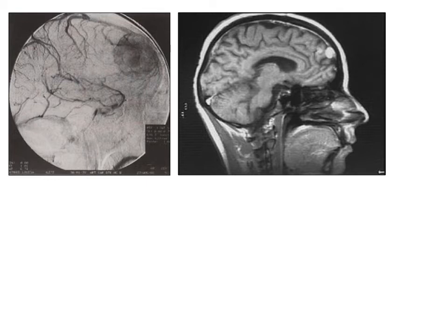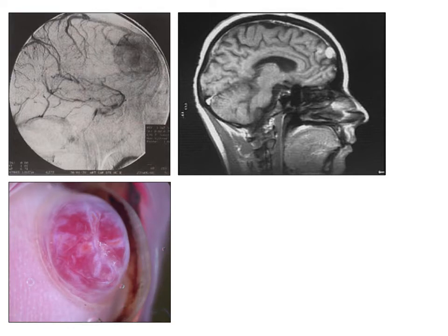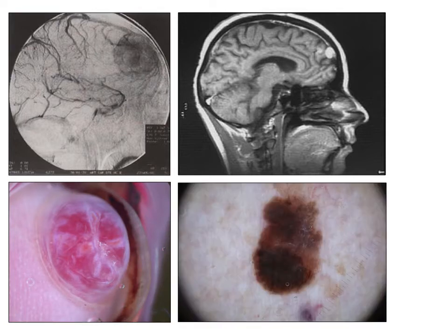The same comparison exists with vascular and pigmentary semiology in dermoscopy. With vessels, except in case of vascular tumors, what you see is vessels produced by the host in the stroma of the tumor, not the direct aspect of the tumor. Whereas when you observe pigmentary lesions, what you observe is the tumor itself, and you can draw more conclusions from the latter than from the former category of lesions.